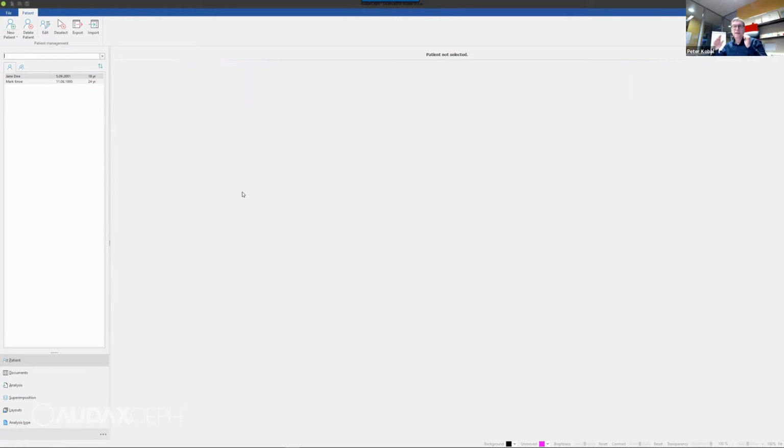It's not going to be, let's say, an all-functionalities webinar. What I'm going to show is a few, not all, new things. And one of these things you might see here is the improved user interface. Yes, we also did something on icons. We are now using the same type of flat icons all over the software.